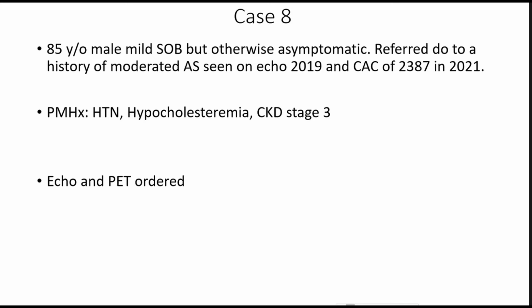echo-free space that is there post-surgically versus what would be seen with infection? Great question. There are a couple tools we have in our toolkit, one of which would be following the echo-free space on TEE over time. So that's a conservative way of looking at it. Maybe a less conservative way would be to do follow-up CTA imaging of that.